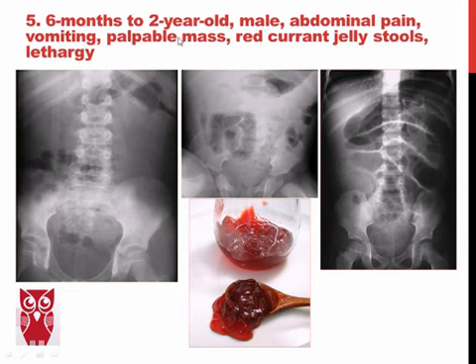The history tells the diagnosis, and everybody is familiar with the red currant jelly stool in a child less than 2 years old that can present with the meniscus sign of a soft tissue mass surrounded by a meniscus-like lucency of the colonic bowel lumen, or the target sign of concentric lucent rings, the lucent ring being the trapped mesenteric fat inside the intussusception, or just small bowel obstruction.